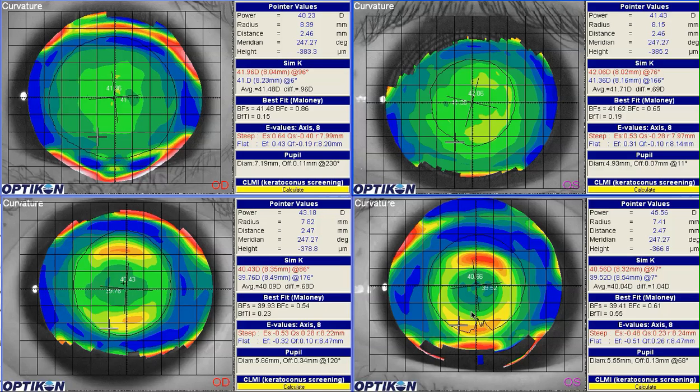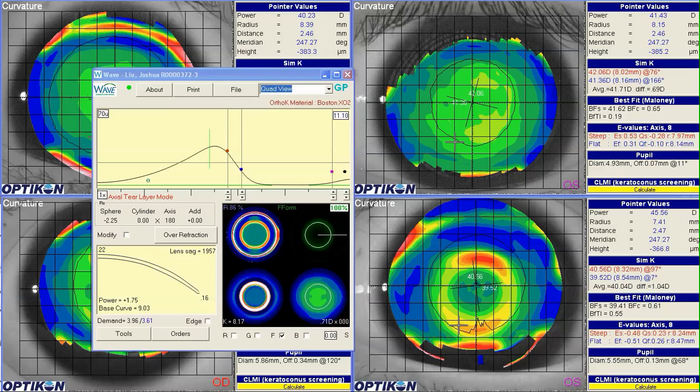In the left eye, I think we have about 3/4 of a diopter, and this one does make a little bit more sense. We can address that just by changing Topo demand. The periphery does seem a little bit loose, so why don't we tighten that up at the same time? I'm going to bring up right and left lenses.